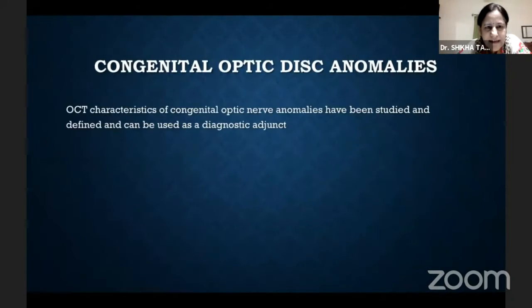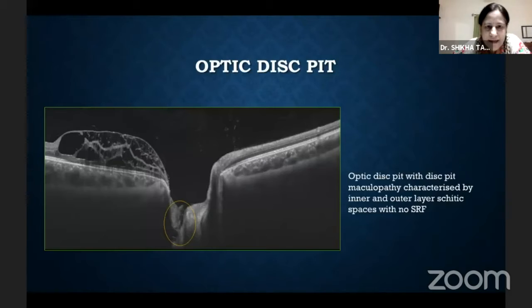Let's go directly into the clinical application of this technology. The congenital optic disc anomalies have been studied by OCT, and peculiar characteristics have been defined. They can be used as diagnostic adjuncts. Let's look at these cases.